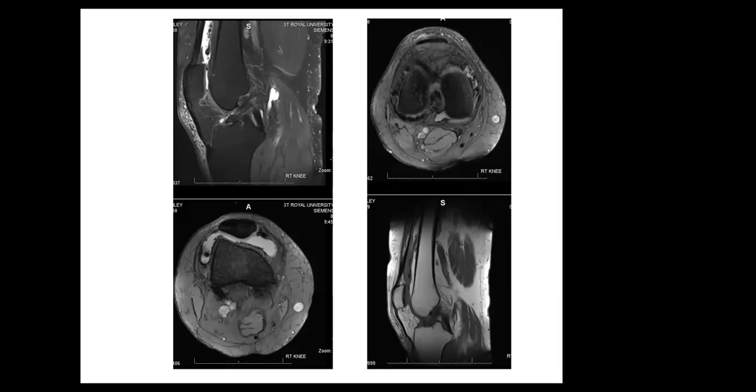Also there is abnormal signal at the suprapatellar area, with multiple rounded signal voids.